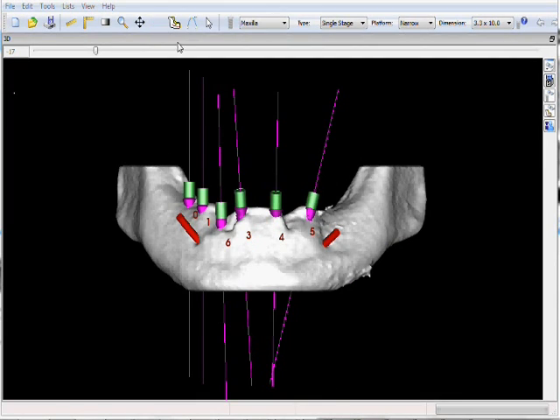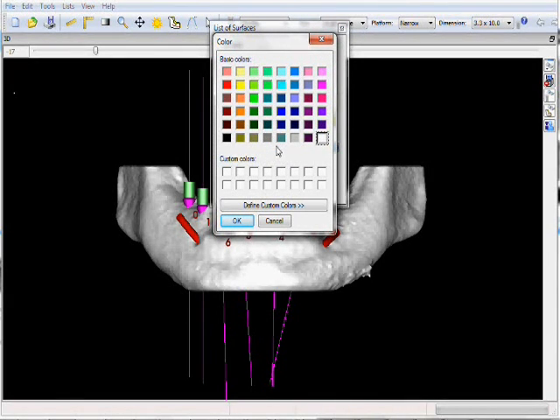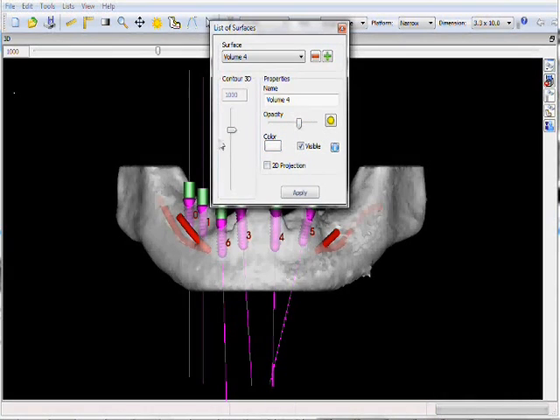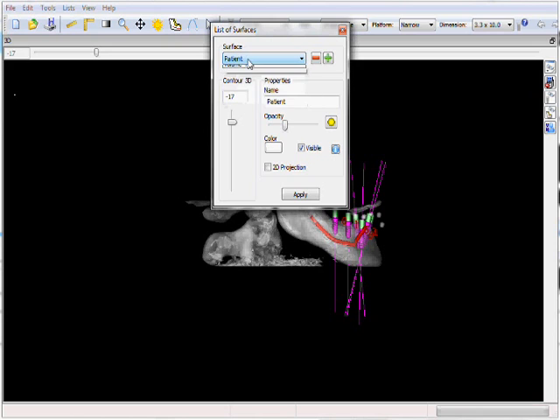In this situation, the software automatically creates a new volume with the single part which we have chosen. This volume can have the color changed or the opacity level, but once again the density threshold has been locked in and this image cannot be cut again. Multiple surfaces can be turned on at once to overlay surfaces or to display more than one.